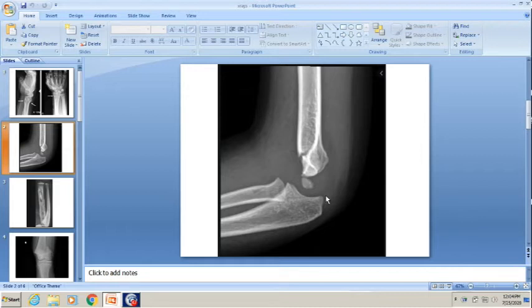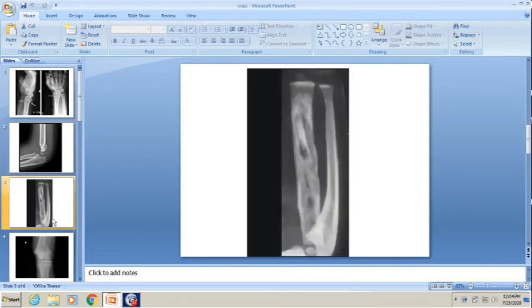Okay. So then we'll go to the next X-ray. So now, first I'll give from 50 to 75, and anyone who wants to answer. What do you see in this X-ray?